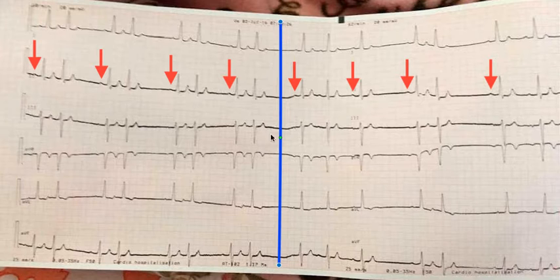But all of a sudden in this point over here, things change. From here ahead, if you see each of these QRS complexes, they do have P waves attached to it. And if you see carefully, the PR interval goes on increasing, and then there is a drop of QRS complex. All of a sudden, there is one more junctional ectopic coming over here, but again the same rhythm follows, that PR interval goes on increasing, and then there is a drop of QRS complex.